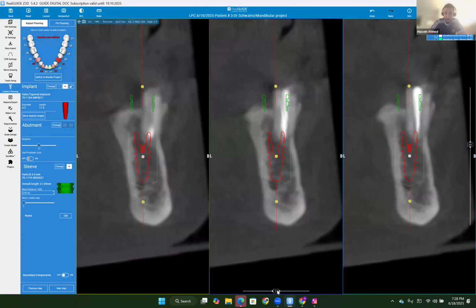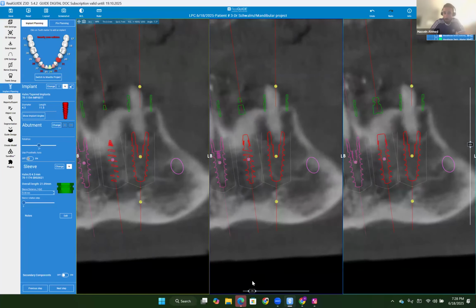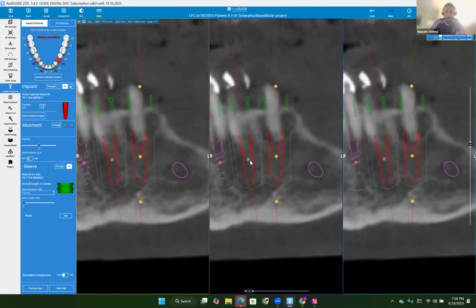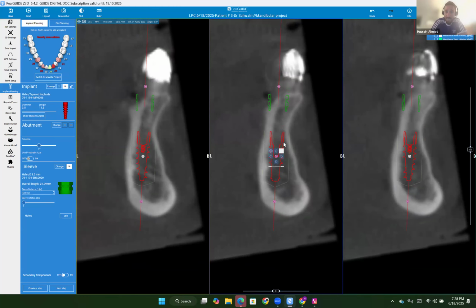Since that's the most distal implant in the left quadrant, we're perfectly clear of the mental foramen and anterior loop anatomy. Then we've got the D position, a 3.5 by 11.5 millimeter long implant. It does get a little bit thin at the coronal aspect, but I could definitely sink my implant a tad deeper for better bone coverage, sir.